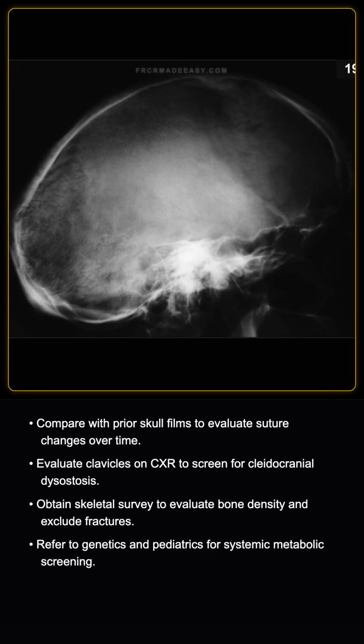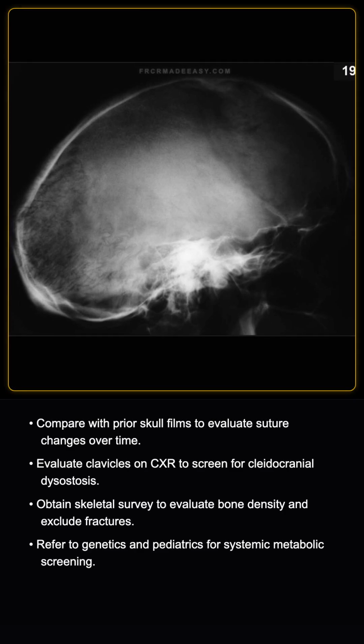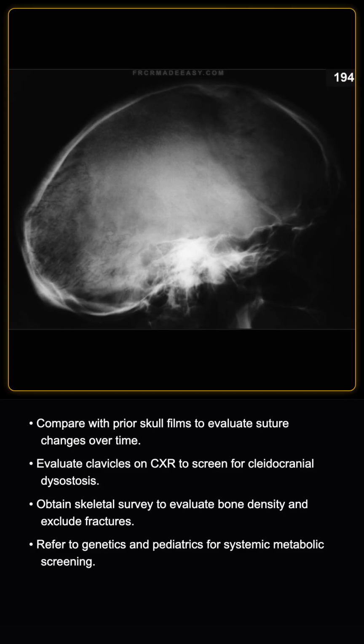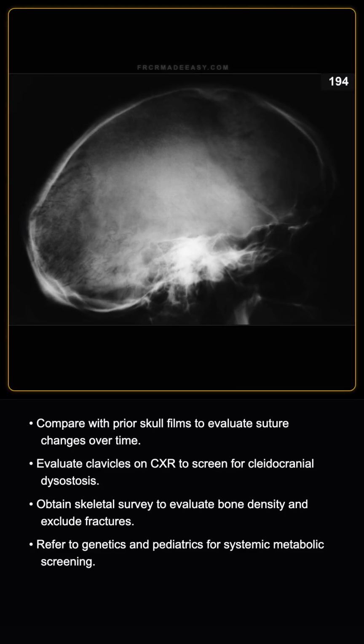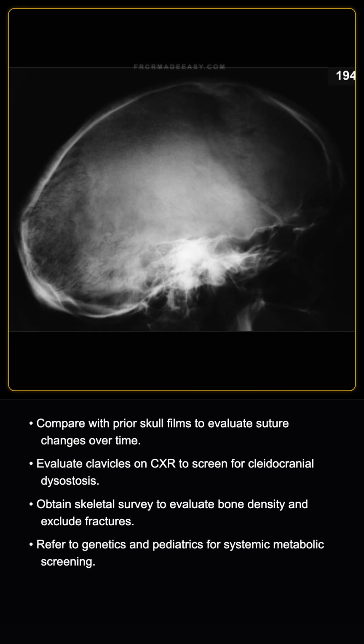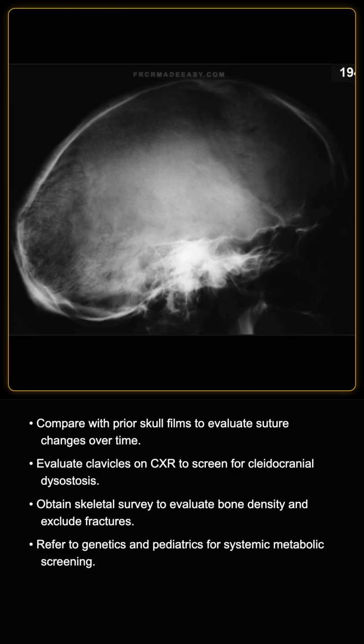I would recommend correlation with clinical history, developmental milestones, and serum calcium, alkaline phosphatase, and thyroid function tests. Finally, I would document the findings, state the differential diagnosis, and refer the patient to pediatrics or genetics if systemic anomalies exist.